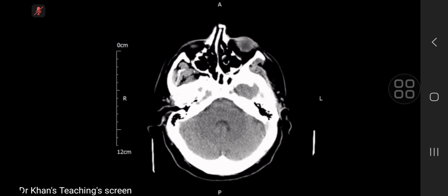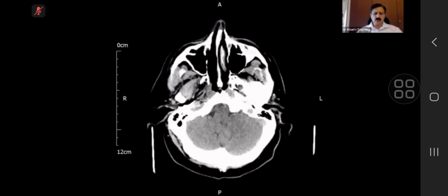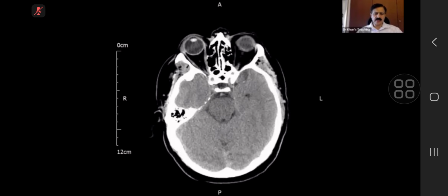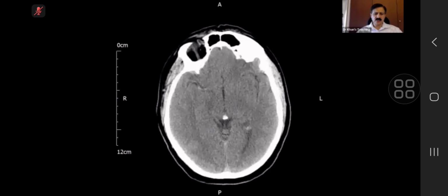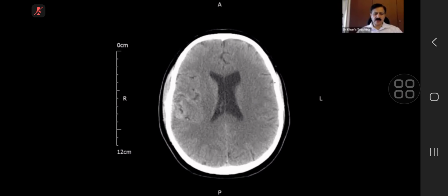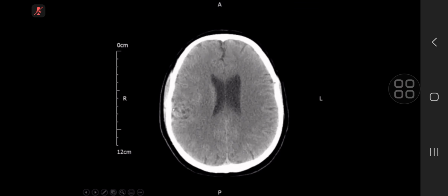Yes, I can. Okay, so I'll take you through this case, and this is the type of case you are expecting in your exam. Now, when the examiner opens it, it's a CT scan and it's an axial slice, and you are going through, right and left, what is happening. Now, if you see here, something has come into the view.